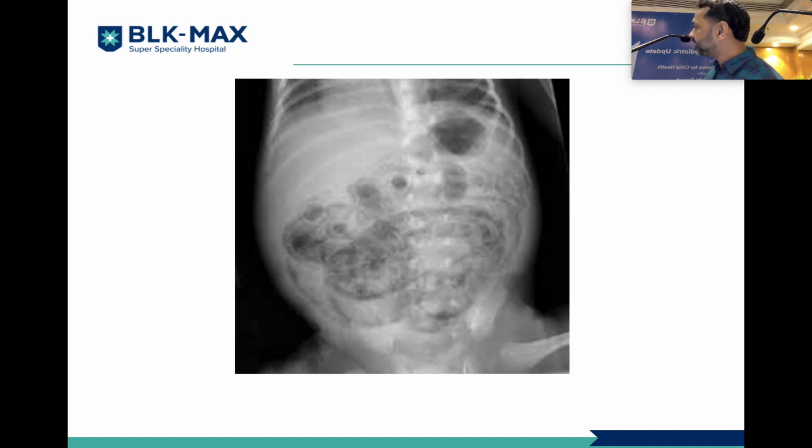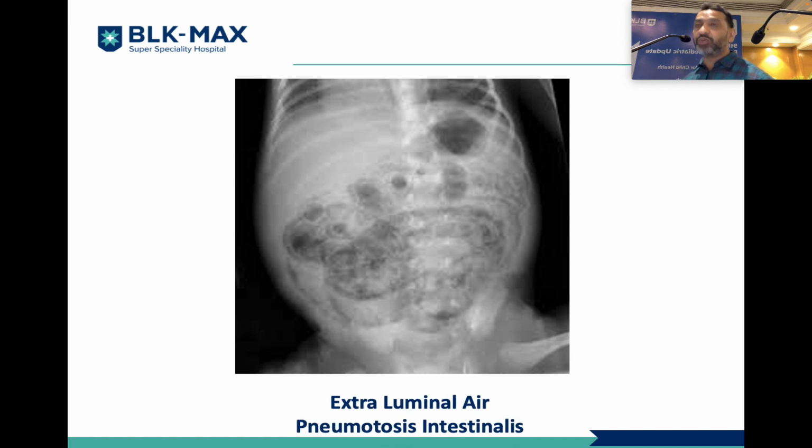Now, this looks very unusual, correct? That doesn't look like intraluminal gas. If you look very closely, this is gas in the form of linear shadows and streaks, which is intramural gas. So here the gas is not inside the lumen, but in the wall of the intestine, which is a condition that can be very critical for the child. That is pneumatosis intestinalis, which suggests that there is intestinal ischemia and this child will require urgent intervention.